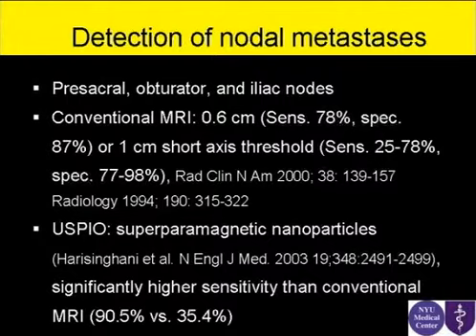If the patient has obvious extracapsular spread or T3 disease, it doesn't really matter anyway, because those patients don't get surgery. But if a patient who is a candidate for surgery has a large volume of tumor and a high Gleason score, and you see a node that's below 1 cm, you have to be careful about that also.